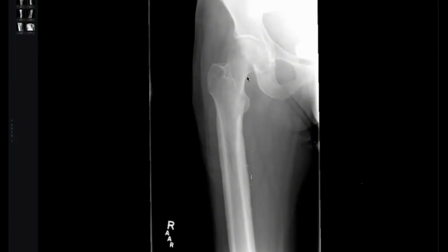My colleague, my advice for all of you, especially with limbs: when you see one X-ray, if you expect this is normal, tell yourself I must look at two issues. If you see an apparently normal bone X-ray, the answer will be within two things. Number one, the density.